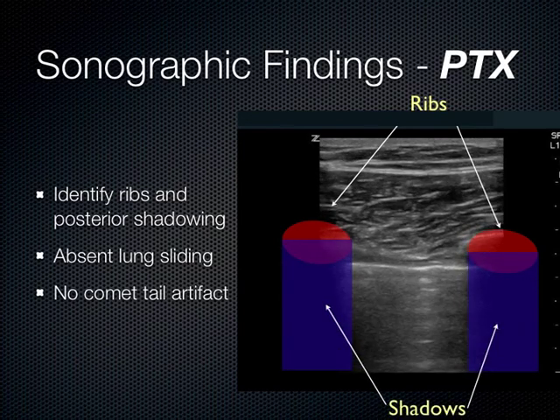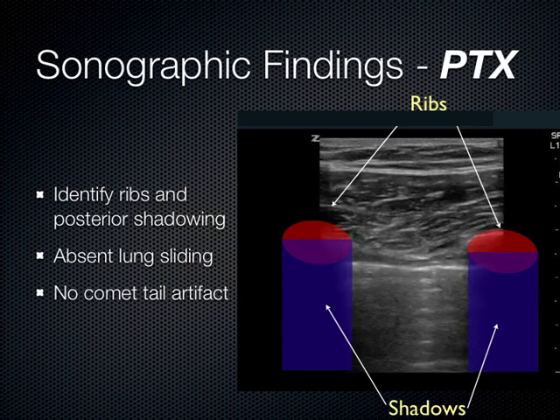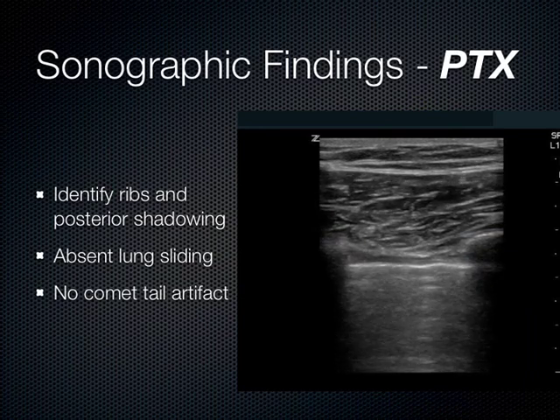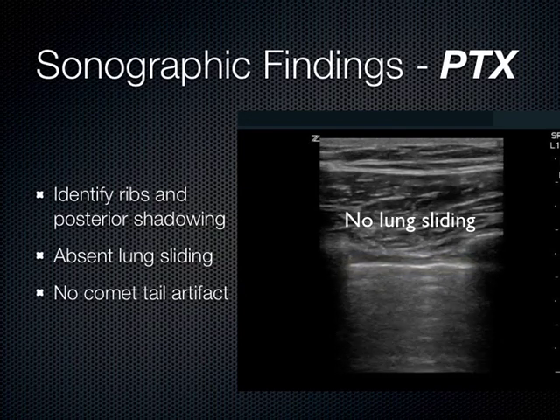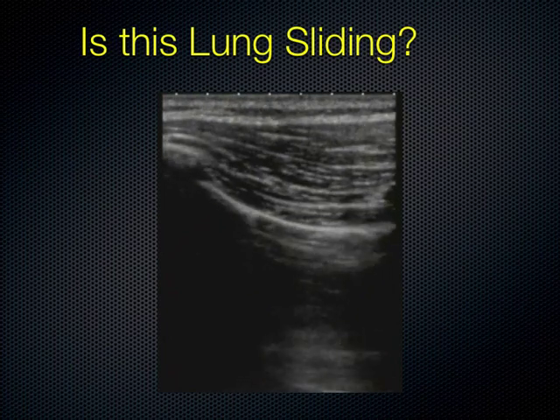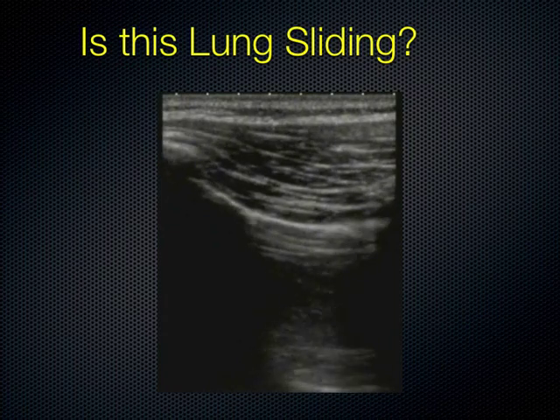Okay. All right. Moving on. Just a couple examples. Is this lung sliding? So, pneumothorax or not? No. Good. You're experts now. That's really all you need to know. How difficult is it to get that image? Very easy to get the image. You will all be flying through this and then looking at kidneys and hearts later today, because it's very easy to get the image.